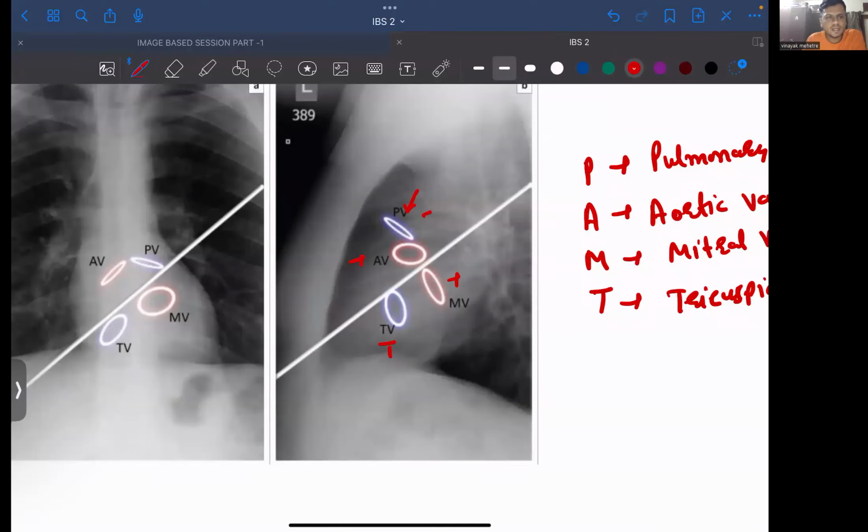Take a look again and again. All four rings will not be given, only a single ring is going to come. Think anatomically, it is just the same. Okay, it is just the same. It is not going to change.